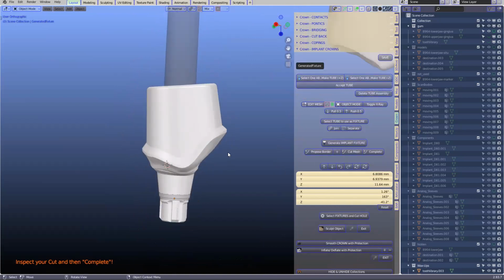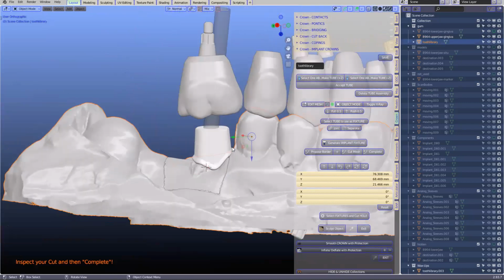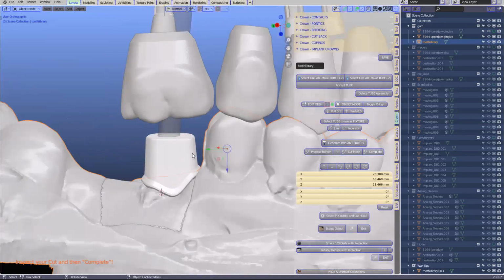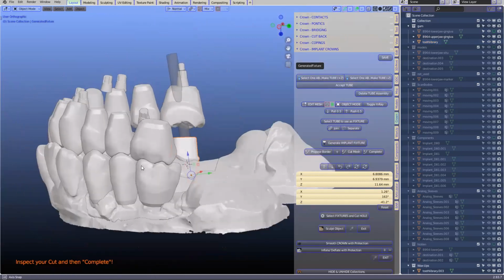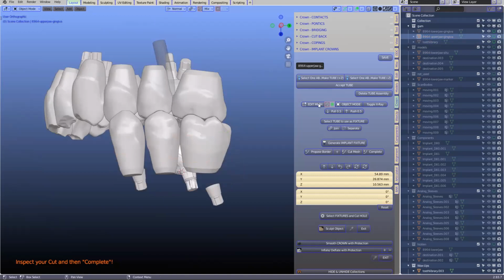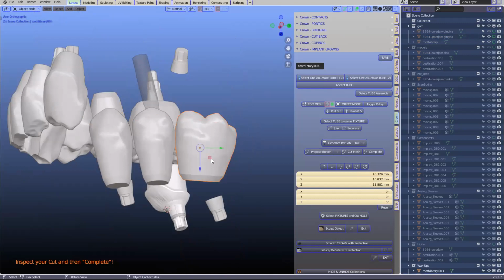I had a question here, Michael. Is it possible to angle the occlusal part? You can show us in the next one if you demonstrate another one. And you can show how you can make that step, that bevel, you can actually invert it. So it doesn't have to be round. It can take on an S shape or whatever shape you wish. That's correct, and we'll cover that in our tutorials as well. But for today, let's just keep it light.